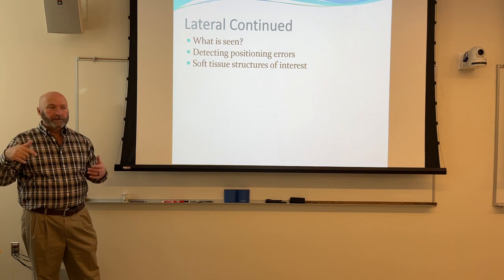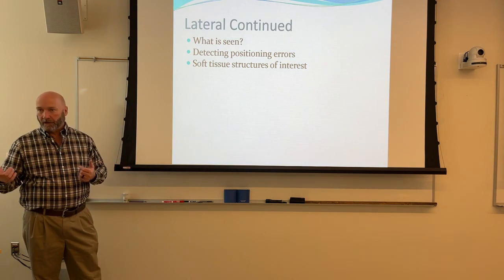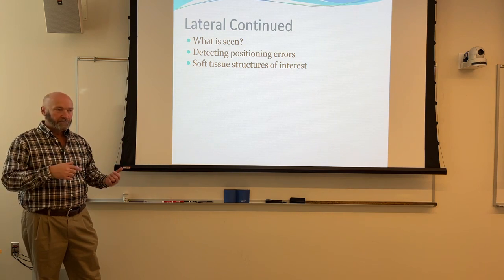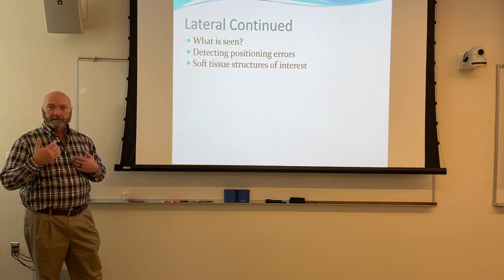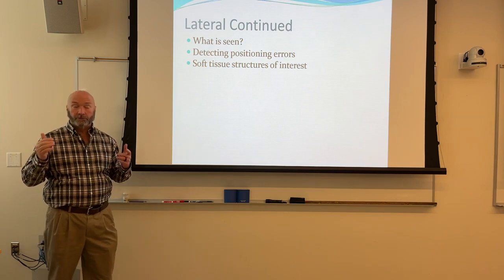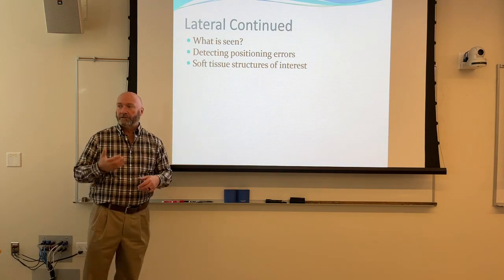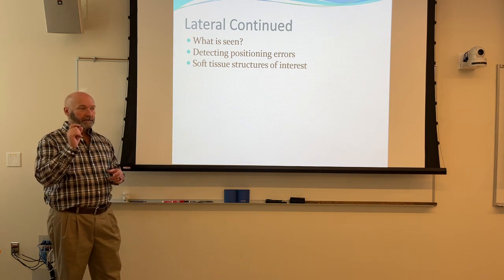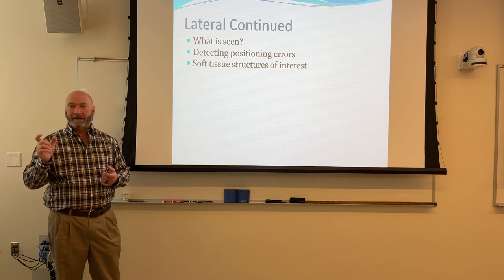All the images that I put into this, I think were probably a day or two after the trauma that caused the injury. My personal experience is every time that I've had a patient with a true C-spine injury, not whiplash, but true C-spine injury, the swelling was such that that prevertebral fat pad, instead of being maybe a half an inch, was, you know, 2 inches. It was massive.